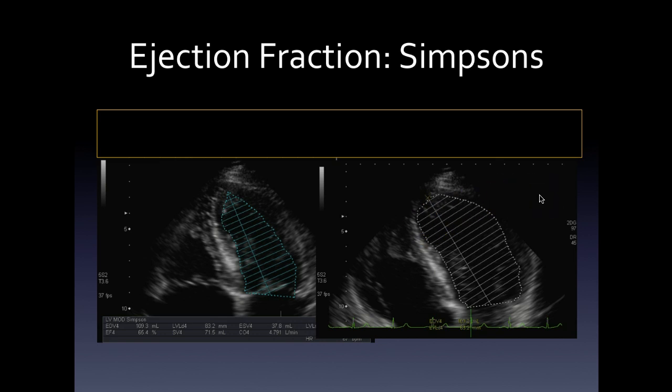And that's terribly important because if somebody has had an apical infarct, that's the very area of the heart where the regional wall motion abnormality is, and that's the area of the heart that's hardest to see, because the focal point of the ultrasound beam is generally a lot further down into the field, somewhere down around here. You can get very technical and you can readjust the focal point of the ultrasound beam, but you're getting into very technical changes then when you have a load of other things going on with the sick patient. But it can be done, and sometimes it should be done.